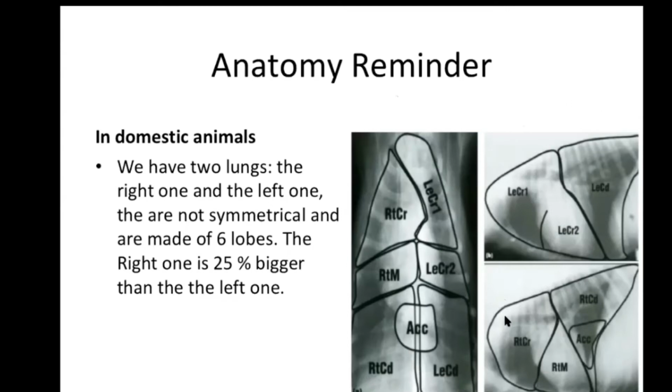And the other one is the side view. We can have left or right, of course. The animal is in lateral position, and we can see the left side or the right side. So that's very important to know what's the position the animal is laying in. On the back, which side is the right, which side is the left.